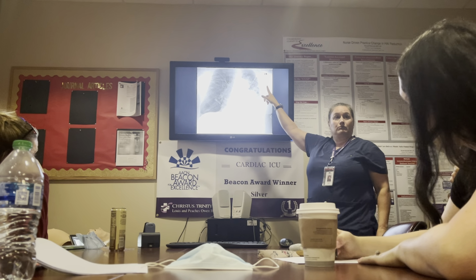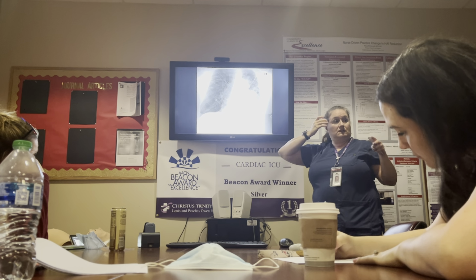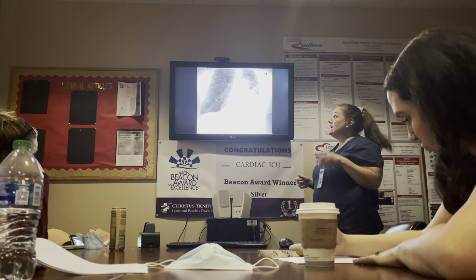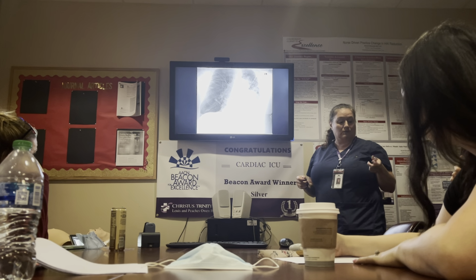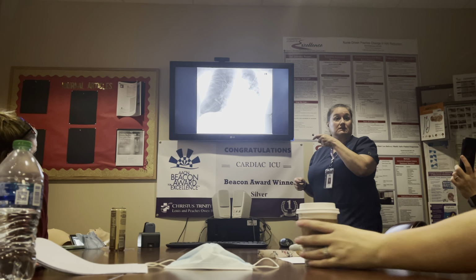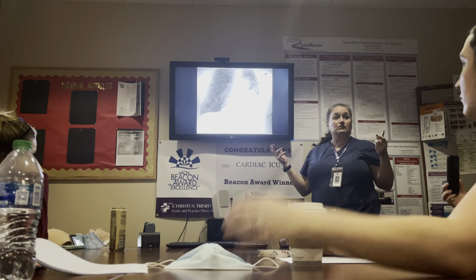It's not a good film. It cuts off the apices, okay? So when your radiology tech comes in and says, do you want me to shoot an extra film, when we're looking for, say, line placement or tube placement, if I've got enough information, I probably won't make them do the repeat x-ray. But if you're looking for a daily comparison, you may need to have that, or if you're suspicious that they've popped a hole in their lung and they've now got a pneumothorax, and you can't see the apices, you really don't know.